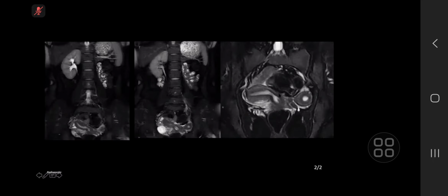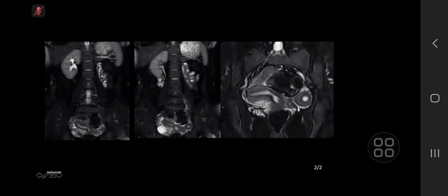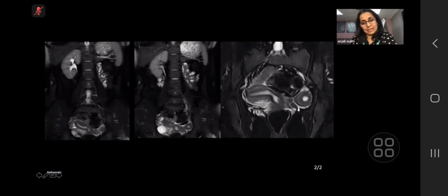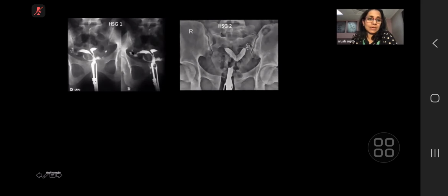Okay. So we were actually looking at a unicornuate uterus with a non-communicating left horn with functioning endometrium. So this is subtype 2B. Is there anything else that you can see? I can see that there is a normal right kidney, but an absent left. Well done. So these are commonly associated with renal anomalies. If you're given a Mullerian duct image, make sure that you ask for imaging to look at the kidneys.